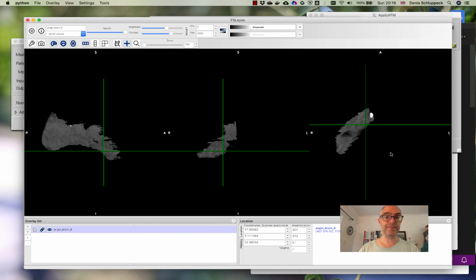Okay. So hopefully you see the parallels between this way of doing things and the idea of logical indexing in MATLAB. You could also have implemented this particular sort of breaking the big image up into smaller chunks in some MATLAB code if you prefer. Either one is fine, whichever way you find easier to deal with. Okay.